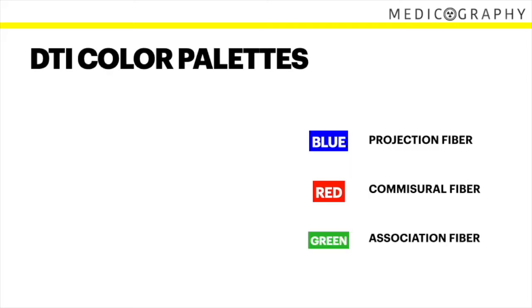So this is the color palette. But just remember, this color palette is the conventional color palette. I bet in 5 years, or even now, I have seen some DTI MRI that has different color palettes, because this is just a convention. If you understand the basics and the principle of the tracts and the DTI color, you won't be confused if the conventional color is turned into other colors. But yeah, we are going to assume that we apply the conventional color.